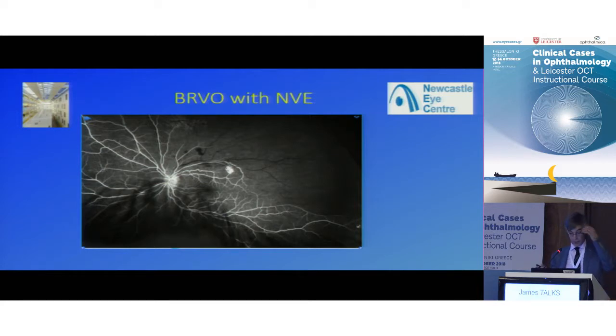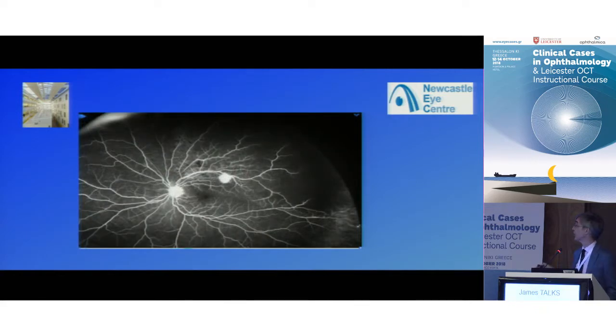Another aspect of vein occlusions, of course, is ischemia. So this is a wide field of a branch retinal vein occlusion that really is very ischemic. You can see there's almost no circulation in that quadrant here, and there's a bit of new vessels. This is an early stage of the fluorescein. As we run through, they do begin to reperfuse a bit, and you can see it leaks. And the vessels in the ischemic area are all leaky. They have this sort of fan-shaped effect. So this patient's got new vessels in the ischemic branch area, probably need to be considering laser in that area.